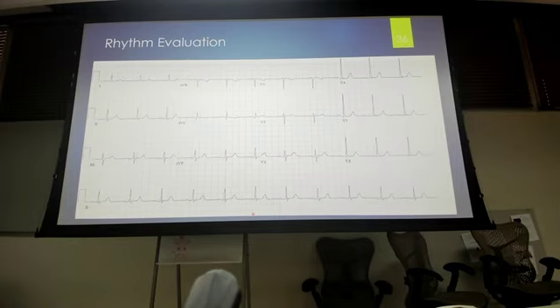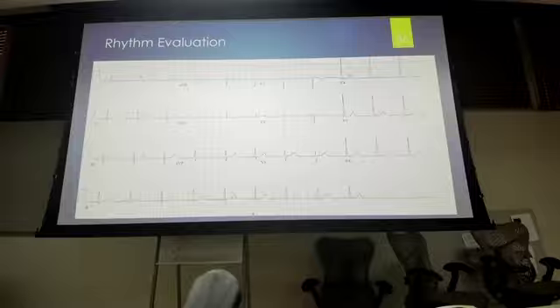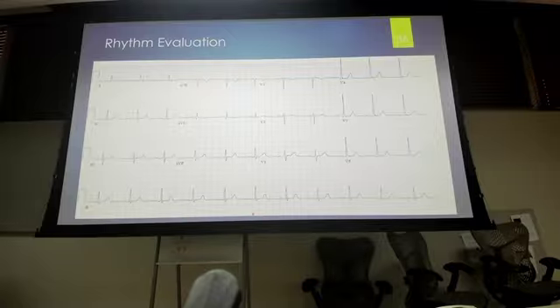And yes, at the top of your ECG, it's going to tell you what the rate is. But you need to know how to calculate it, because I don't believe anything that machine says except for the QT, because I'm not calculating that QTc.